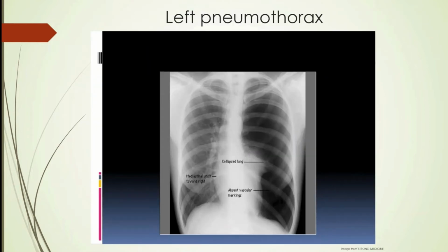And this one here is again pretty easy to see. To go back to our method, you can see the trachea coming down. It was pretty difficult picking out the carina. So it makes it a little difficult seeing the carina in this picture. And I know I've talked about the thoracic vertebral bodies, and even those are kind of difficult to see here as well.